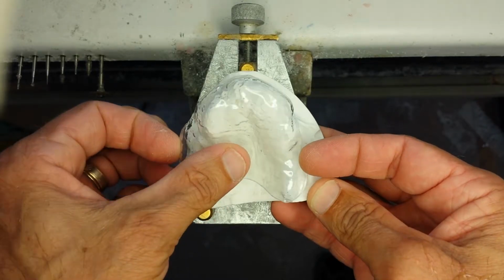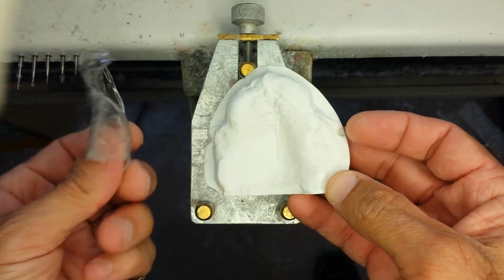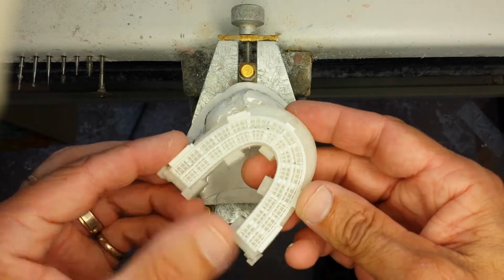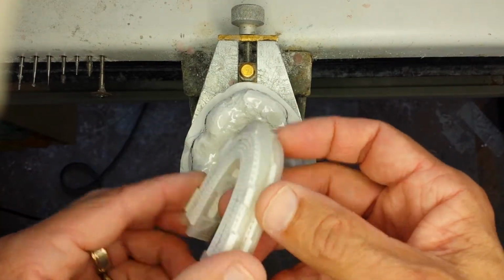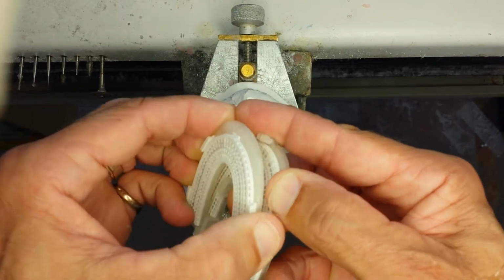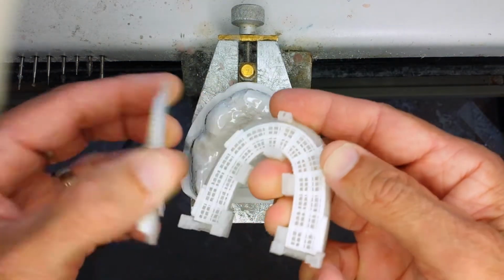A mold is thermomechanically formed. On this example, a toothless superior maxillary. The SIG is composed of two parallel radio-opaque grills superimposed which clip together.